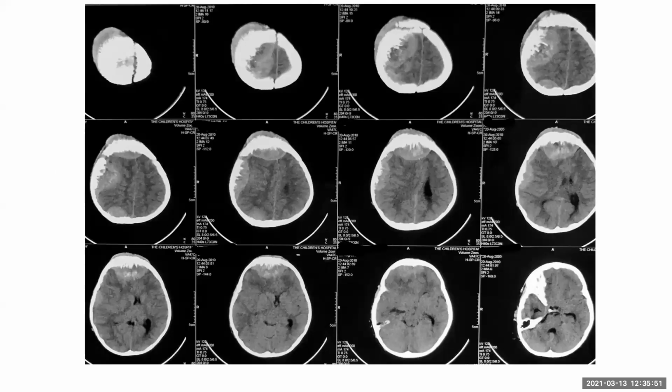Okay, so a CT scan was done for this patient to further assess. Because remember, the patient has headache also now. Oh yeah, so I can see the soft tissue swelling that we visualized on the radiograph is seen extending intracranially also. There's an intracranial component involving the entire frontal bone and the right parietal bone.